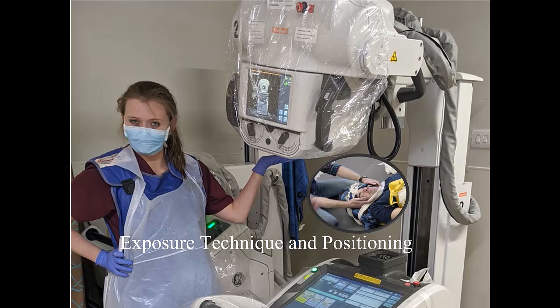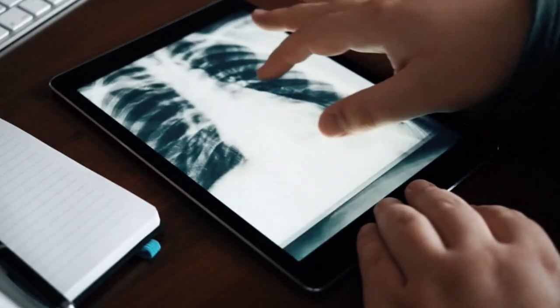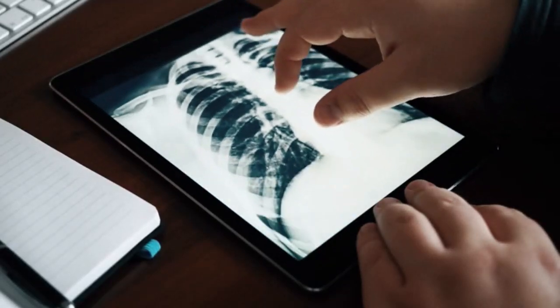Trauma exams are not routine diagnostic exams. They are solutions to analyzing specific problems caused by trauma to the patient. The radiographer must understand that the physician is in charge, but the radiographer must also evaluate the situation. The chest examination is usually the first exam requested.